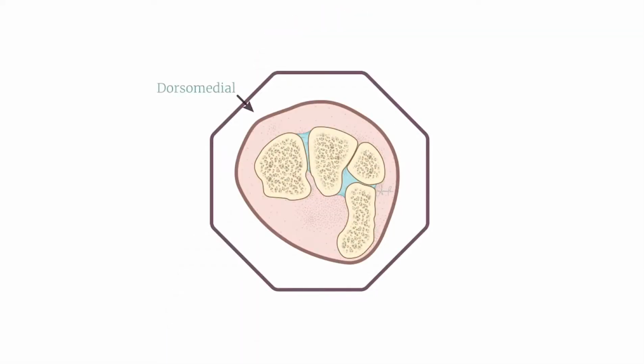Before we look at the oblique radiographic views, we want to revisit the couple of surfaces that we are going to use to take them. We had the dorsomedial, the dorsolateral, the palmarolateral, and the palmaromedial surfaces of the carpus. These are the surfaces that we are going to use to position our beam source and our plate for the oblique views.